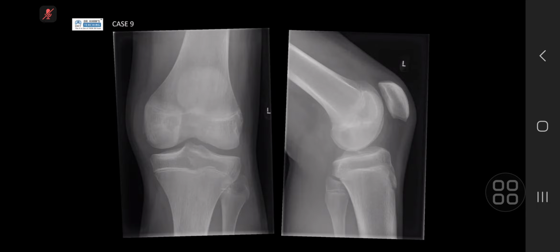The most worrying for me is that in the medial condyle of the femur, there is a rounded lucent lesion with a thin sclerotic margin. It is well defined. I see some soft tissue swelling. However, I don't see any evidence of effusion in the joint space.